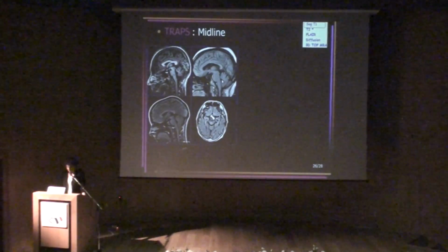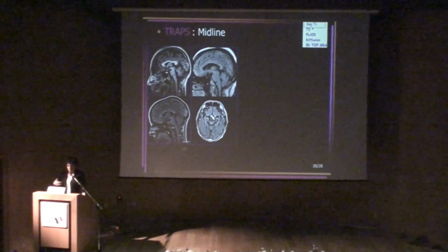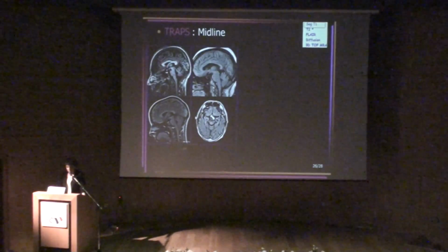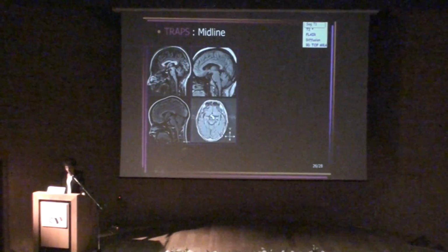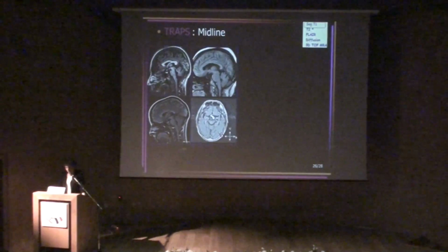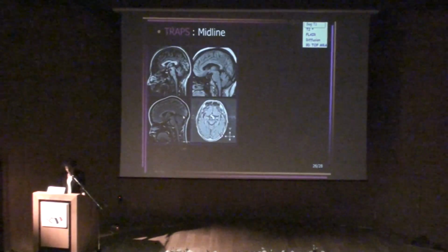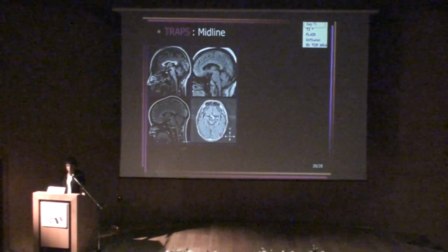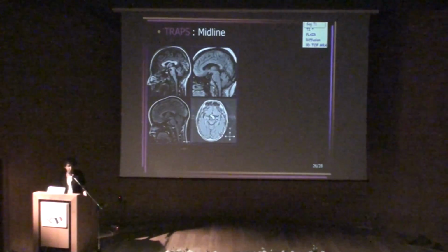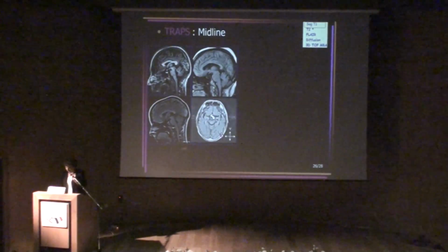And there is a trick here that you don't even have to run another sequence. Let's say the patient is gone and you haven't done anything else. To diagnose an aneurysm here, you simply have to enlarge the window level and look for flow artifacts in the phase encoding directions that will allow you to make the diagnosis of aneurysm without any MR angiography. I'm not saying this patient doesn't need MR angiography, of course.